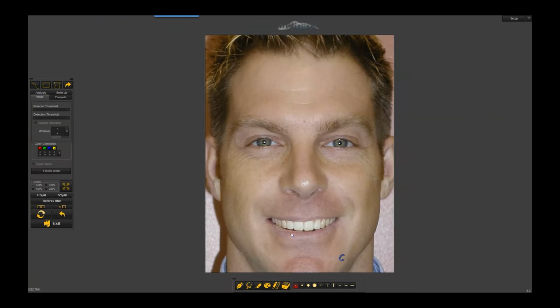You would export it to your computer, via email or to the desktop somewhere, and then because it's a separate process, you would have to go to Open Dental and import that into the patient chart. So you would have to do that part manually at this point. Okay, so that's pretty bulky. The reality is that probably isn't going to happen. We can export it to a folder on the desktop, and then it can be imported from that folder into Open Dental.